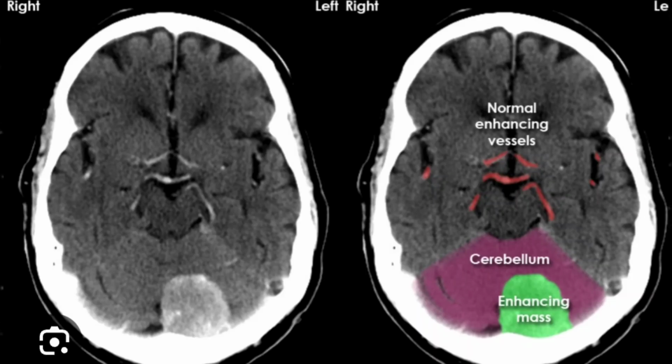In the above axial CT images, the color coding picture is also given along with the normal axial CT image. Here you can appreciate a posterior fossa, well defined, hyperdense, extra axial lesion, and there is calcification in it along with intense enhancement. However, it's not uniform enhancement, it's patchy, but you can still appreciate it. Bone hyperostosis you can only see in the bone window.